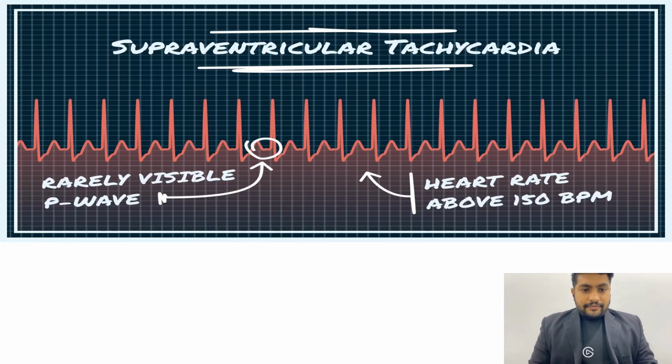Next up, if you look closely, our QRS is very narrow based, and we cannot see a P wave with any of the QRS complexes. We can see that the rate is very high. These are not the standard boxes, so I cannot calculate the rate here, but you can see that the rate is very high, and there is an absent P wave, and there are narrow QRS complexes. So this is our SVT.